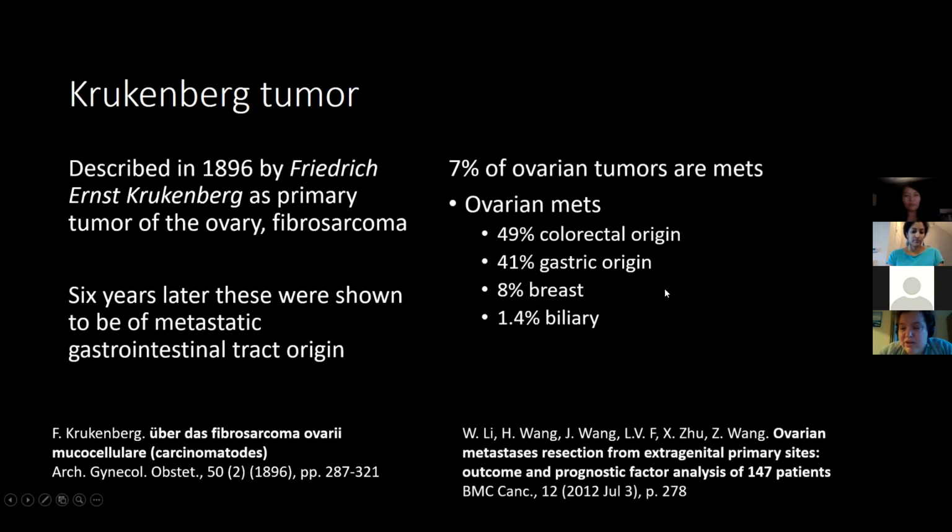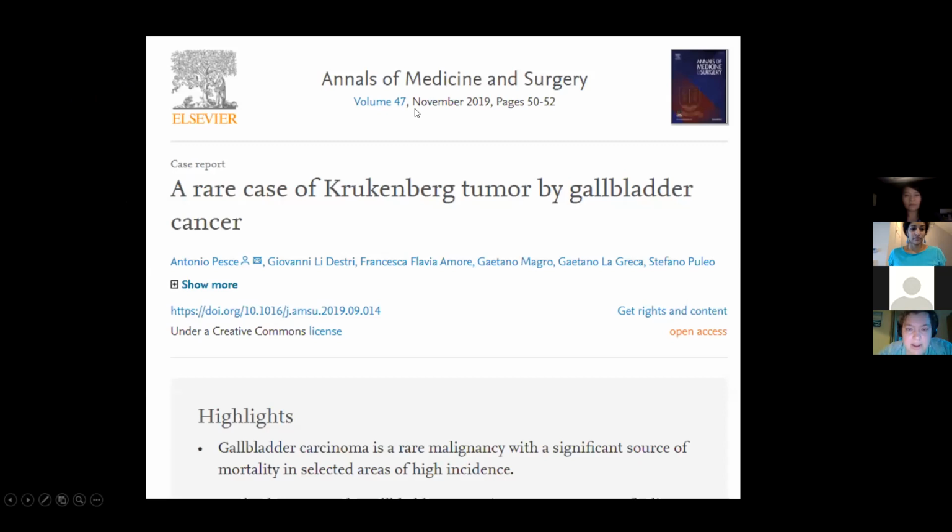The patient did undergo the rest of the evaluation, and there was nothing else. So it is probably intrahepatic cholangio. And it's actually pretty rare. This is a case report that was just published last year. So that's it. Any questions?